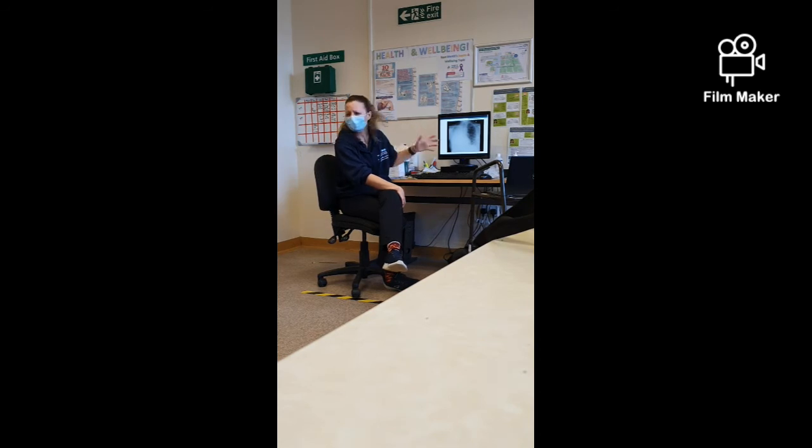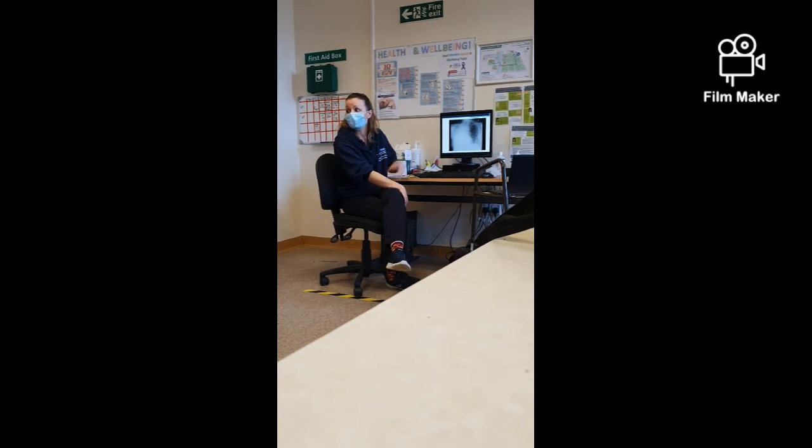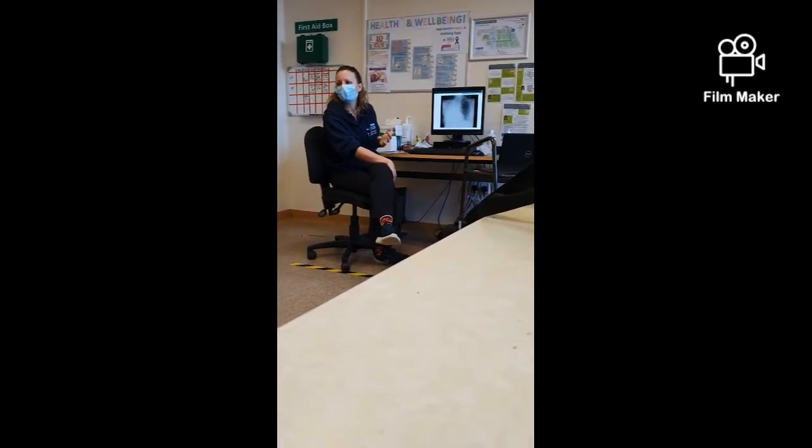Okay. So again, we know something's not right with this chest. Is that the heart where it's 2/3 on the left and then a third onto the right? The heart should be 2/3 onto the left. I don't think it's 2/3 onto the left now. But we know something's going on. We've got a deviated trachea, we've not got clear lung fields, we've not got equal expansion, and we've got potentially a bit of a shift of the heart.